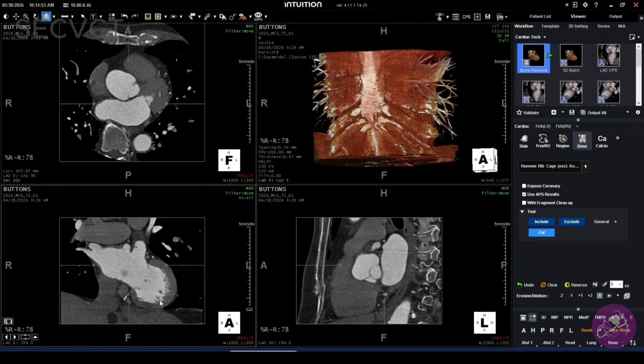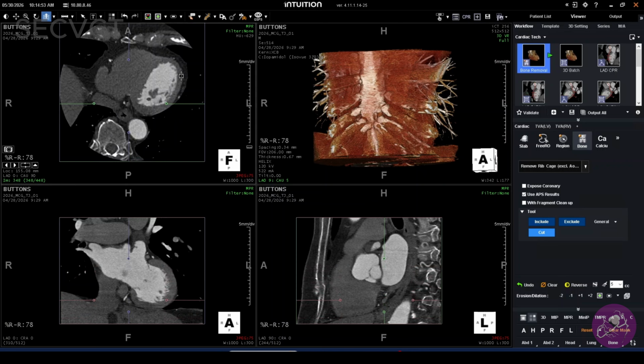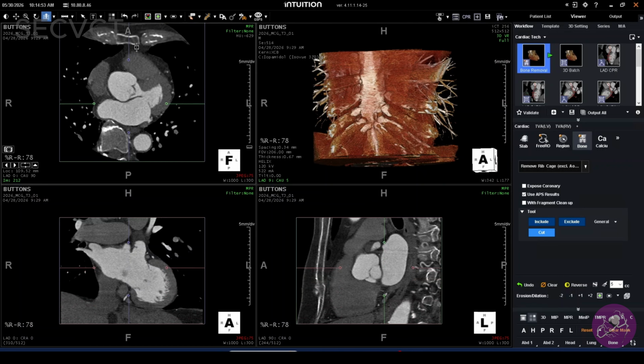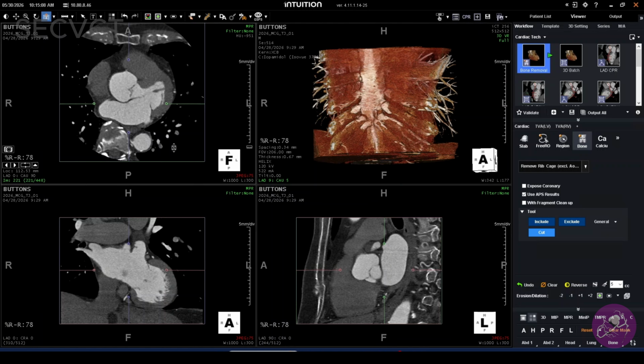A little bit of mouse controls. Your left mouse, if you hold down, will scroll. If it is scrolling really quickly and jumping around, there's an icon that's currently lit up blue. It's a box with an arrow in it. There's a little drop down and you can change that to control and it will scroll a little bit more smoothly for you.